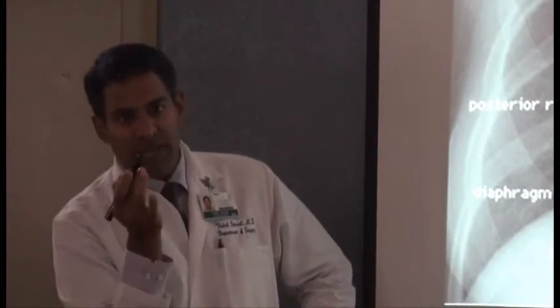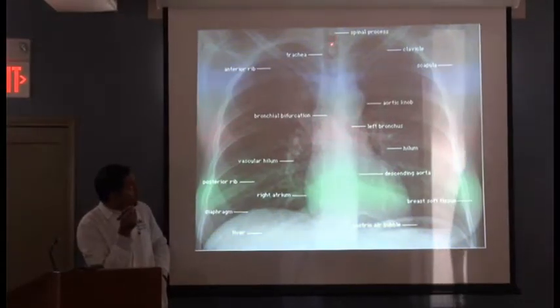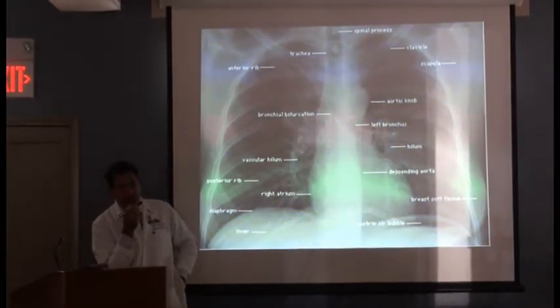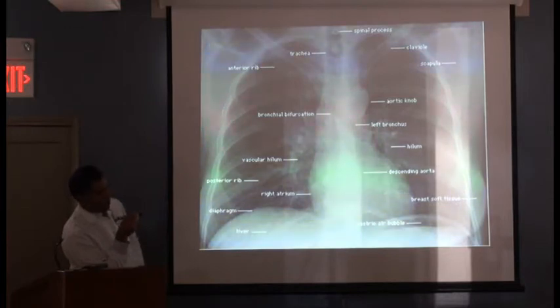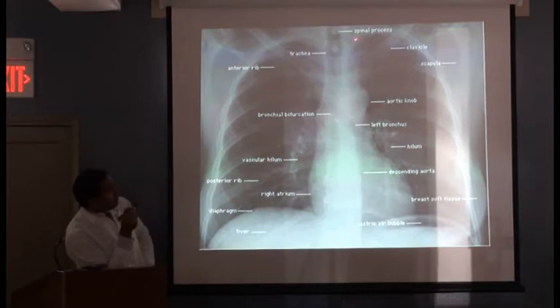All right. So the first thing I do is A, airway. So let's look at this. Here's your trachea. Remember, in a chest film, things that are dense are bright. All right. So bone, like those ribs, are bright. Blood-filled heart is going to be bright. Things that are dark are going to be air. So even though your spine is back here, see the darkness right here?